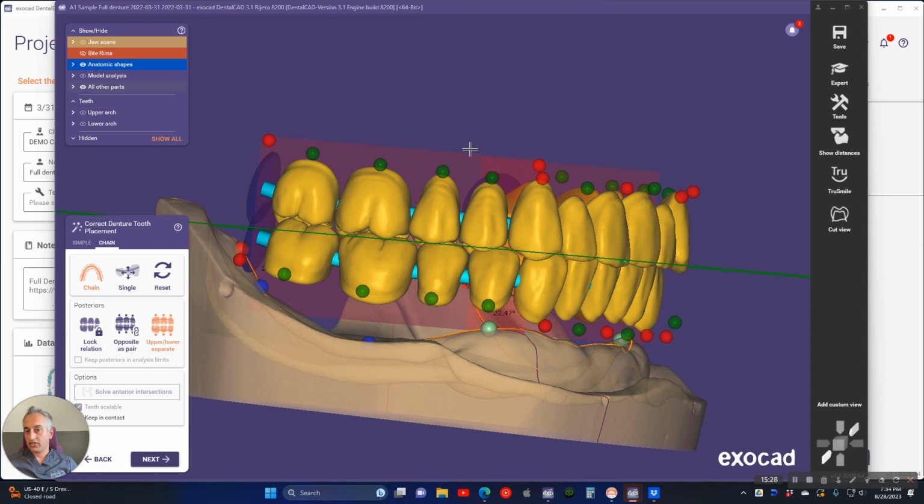And sometimes you got to use all of them, sometimes you don't use any of them, but it's good to know how the teeth are going to move, just so you don't screw up your occlusion once you get everything dialed in pretty well. The way I personally like to do it is I like to get my anterior teeth in the right spot with the right size, and then I set my posterior teeth to match. If I have enough room for a second molar, great. If I don't, I drop the second molar.